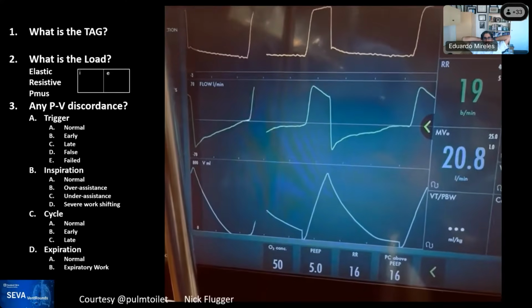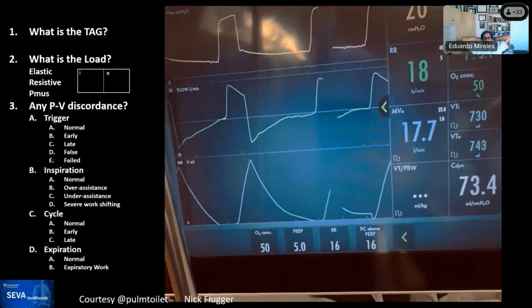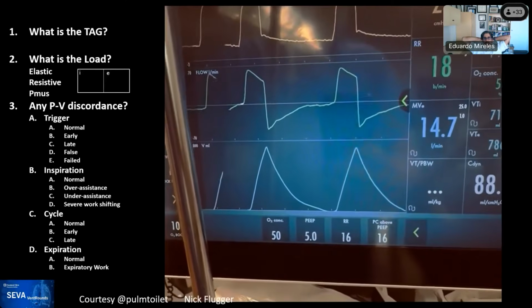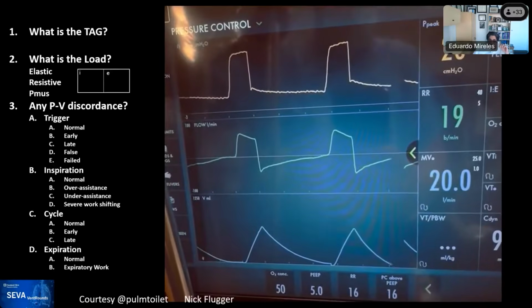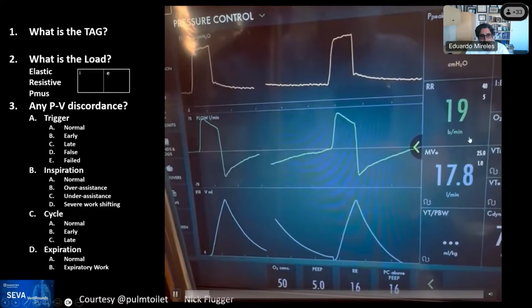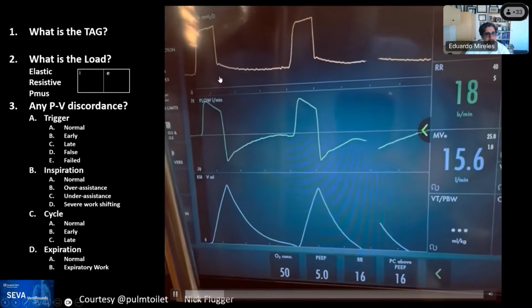It continues in apnea, the tidal volume goes down again, and it starts again. Yes, Mike, that's correct. That's Cheyne-Stokes breathing seen from a ventilator standpoint while you are on PC-CMV.